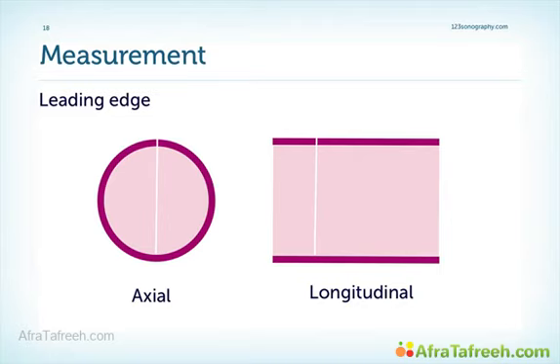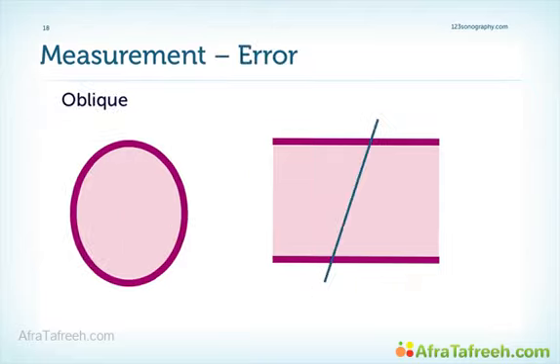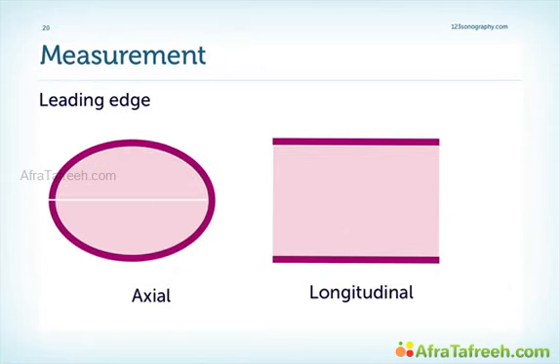Under ideal circumstances, no matter if you measure in a short axis or a long axis view, you should probably get the same diameter for the aorta. However, this is not always true, and studies have shown that there is a discrepancy, simply because often you tend to angulate in such a way that you hit the aorta obliquely, and therefore you get a different diameter, which is usually larger for the short axis compared to the long axis. However, if you see that the aorta is dilated in the way shown in this diagram, so in a longitudinal direction, then you should use the short axis view, because you could miss that in a long axis.